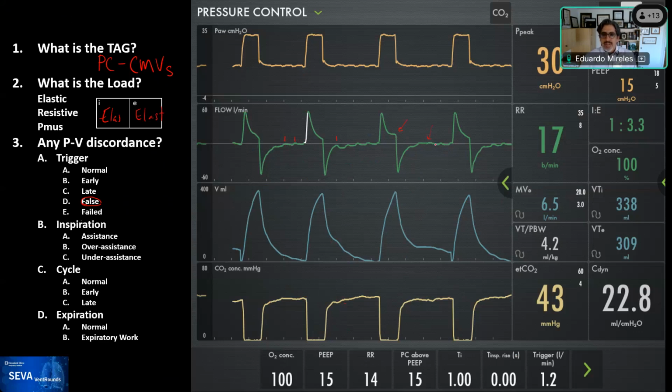So the expiratory phase, if you look at it, it tries to go up, and look what happens to the volume. So the volume waveform amplifies what you see on the flow waveform. So sometimes when I cannot see it on the flow waveform, my eyes travel to the volume because it amplifies what is happening there. So I see this plateau here, and then I come down and see my end-tidal CO2, and instead of plateauing as it should, I see a little dip occurring there, and perhaps a little dip occurring here, which tells me that that patient may be having some inspiratory effort during exhalation.